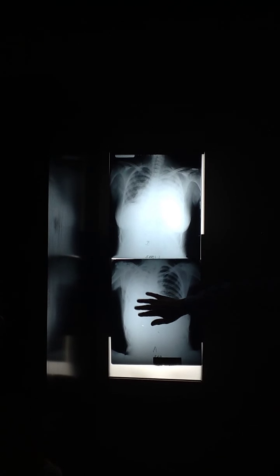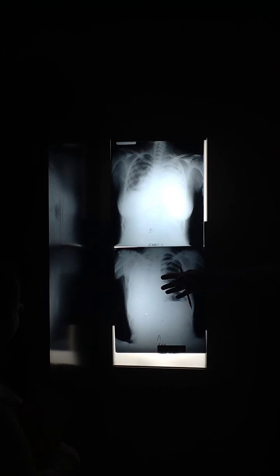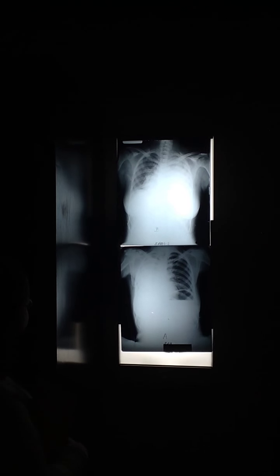And where's the heart border? Well, there's the left heart border. The heart didn't move as much, but the trachea moved a lot. But the whole mediastinum is still going toward. So what's happening? Something's getting smaller. Something's shrinking, it's pulling everything toward it. So here we've got expansion, and here we've got contraction. Shrinking, getting smaller, getting bigger. And where the mediastinum went relative to the density. And that's the whole point of these two.